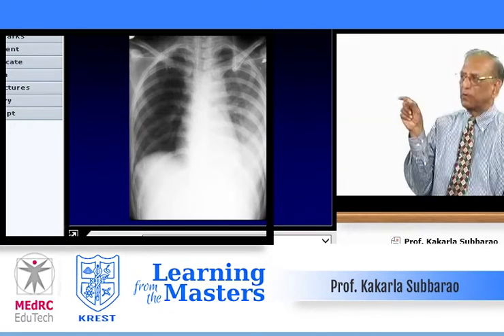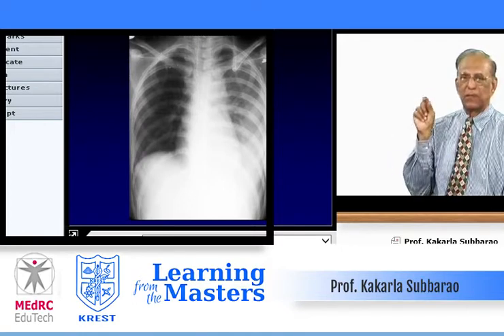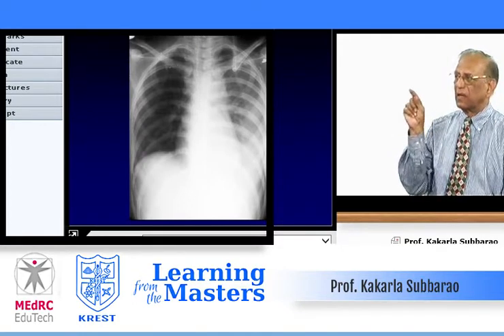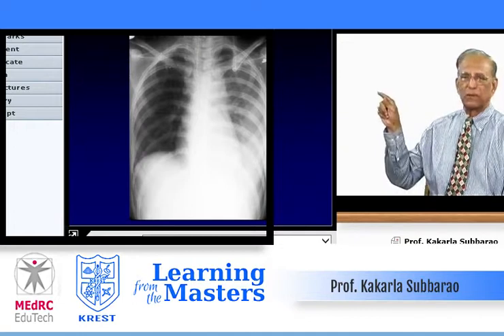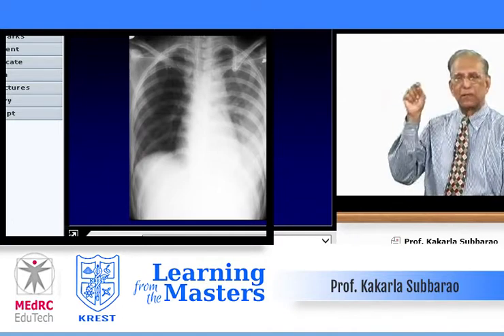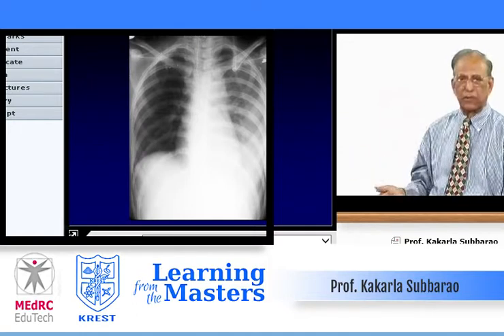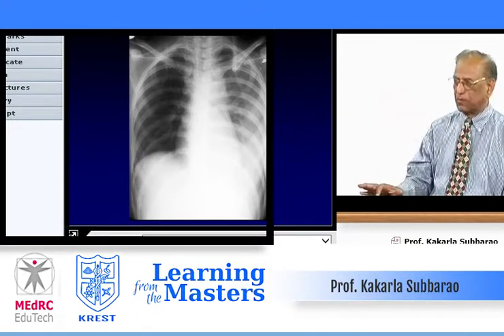And then the superior mediastinum is widened, and the tracheal shadow is obliterated in the lower area. That is because of the dilated esophagus. And there is effusion. It has ruptured into the pleura. Occasionally you may find even a gas shadow along the para-aortic area. Mediastinal emphysema also you may see. This is ruptured esophagus.